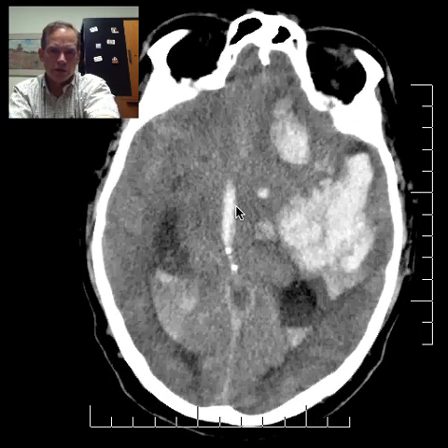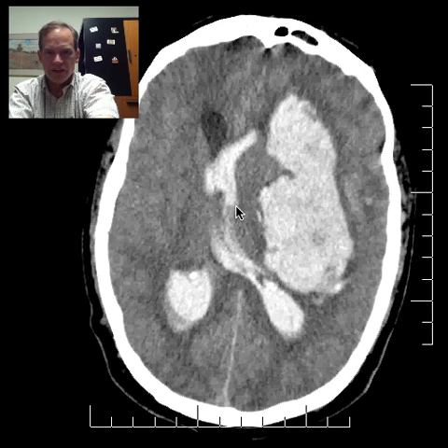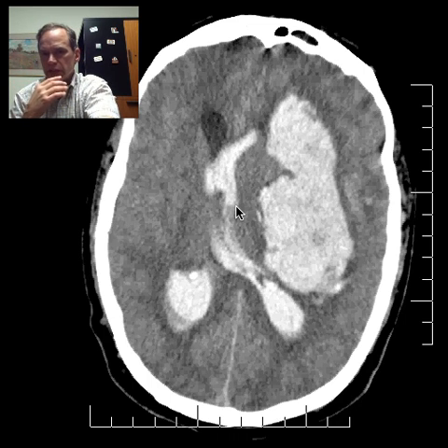So where are we going to look then? Massive midline shift. So phrases I would use here, because I want to communicate the sense of what's going on immediately when something like this is happening, especially. And I don't try to dance around with fancy words.